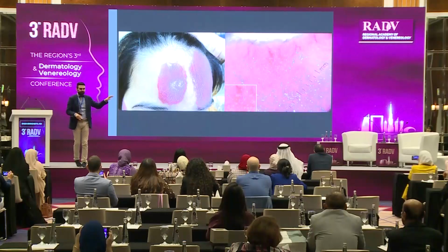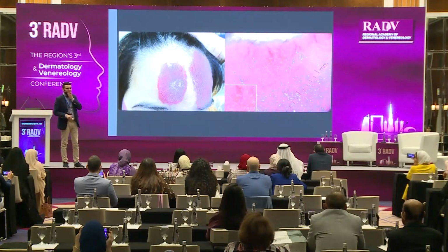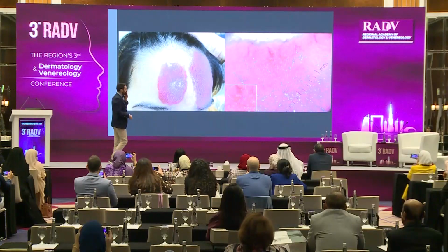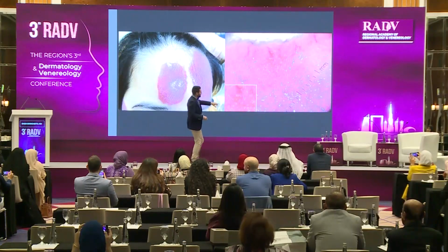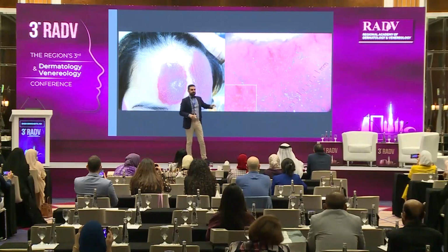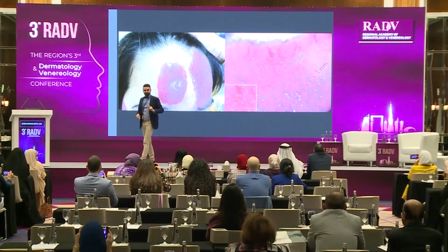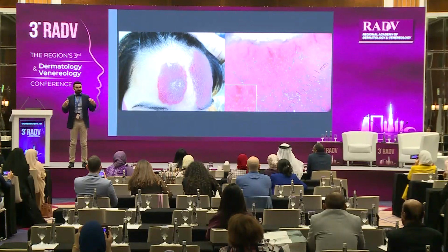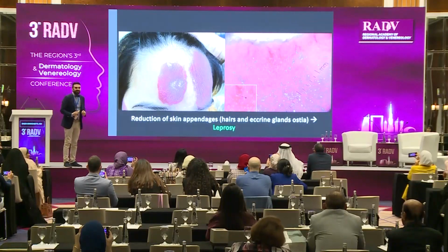Perfect. And this is from Philippines, I think. Here, you can see that we have a reduction of skin appendages. It's a granulomatous condition typified by a reduction of skin appendages. Leprosy. That's right, leprosy.